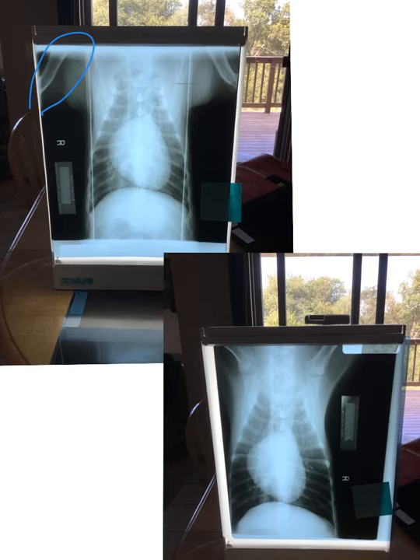Now if we look down at the bottom x-ray, in this one you guys can see they did pull these forelimbs up into the proper position, and that has caused a change in what this cranial thorax looks like. It now doesn't look quite as underexposed. I don't see muscle mass overlying the cranial lung fields, and it has a lot better contrast, and I can do a lot better job of reading this x-ray. So the bottom one is the one you guys are looking for. Good positioning is going to lead to better exposures and diagnostic quality.